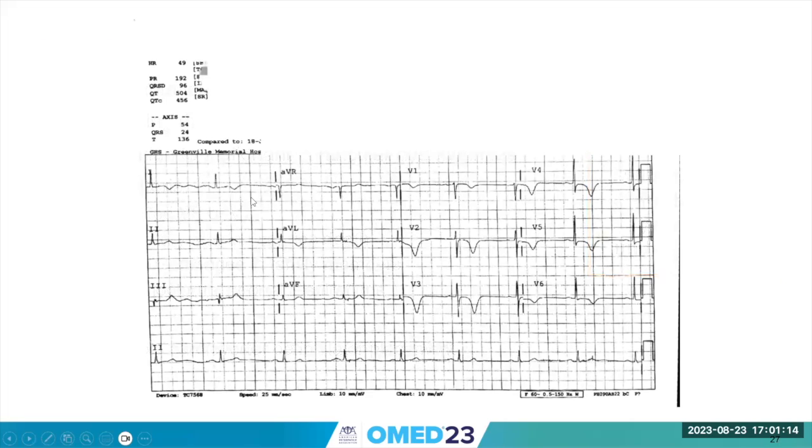And now I think this is another kind of obvious EKG where you can see that there are T-wave inversions, a lot in V1 through V6 here, also in I and aVL, so a little bit of a lateral extension here, but deep inverted T waves. I think we can all agree that this is a scary looking EKG.